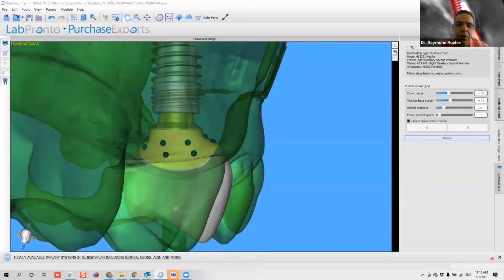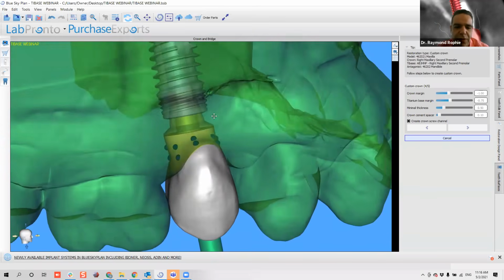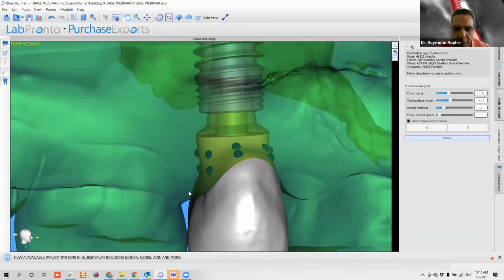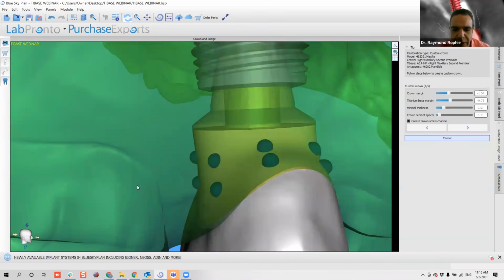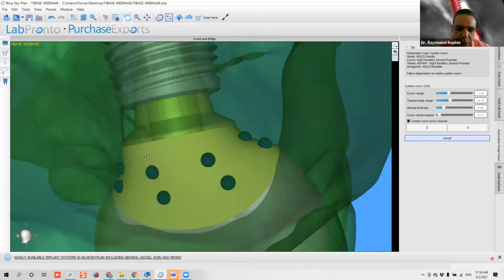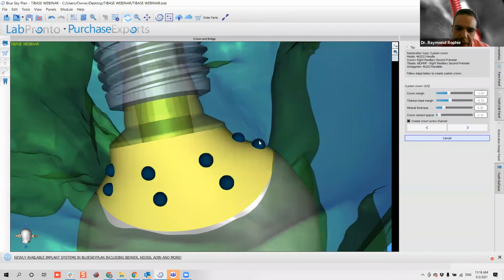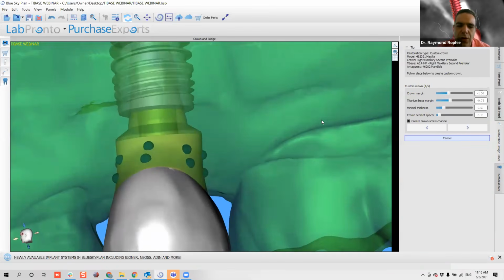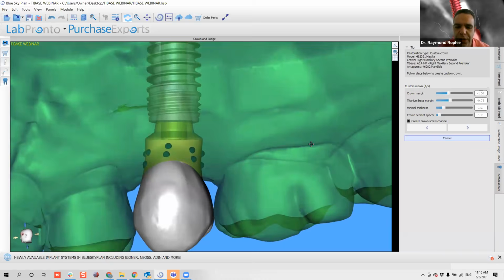So here's someone asking if there is any way to standardize a concave degree. However, it's really easy to see what you're doing by just looking at the profiles. And to be honest with you, there will always be changes between the cases.